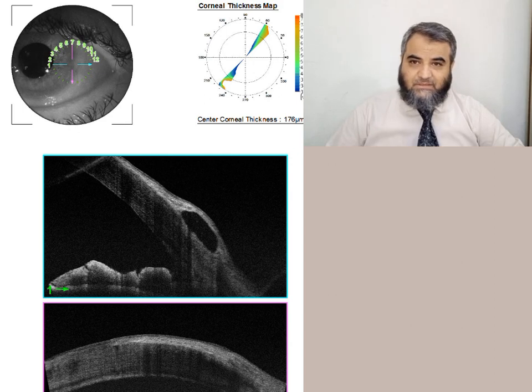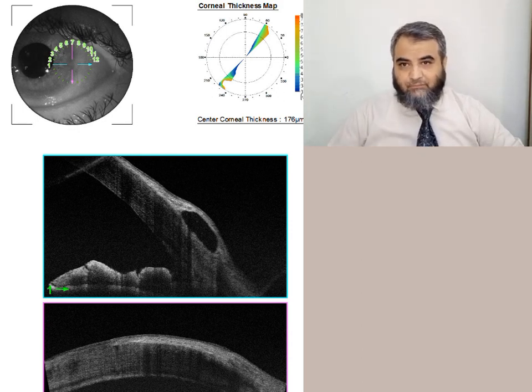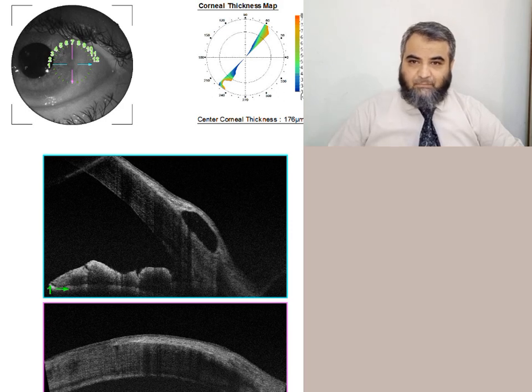The thing about this OCT anterior segment is that the conjunctival epithelium is continuous over the cornea, and there is no abrupt change in the anterior-most layer of the epithelium in OCT. Secondly, the lesion is not involving deep into the cornea or the anterior structures. You can see the angle is wide open, the corneal stroma is not disturbed, and there are some subepithelial fibrotic changes, but the corneal epithelium is not disturbed yet.